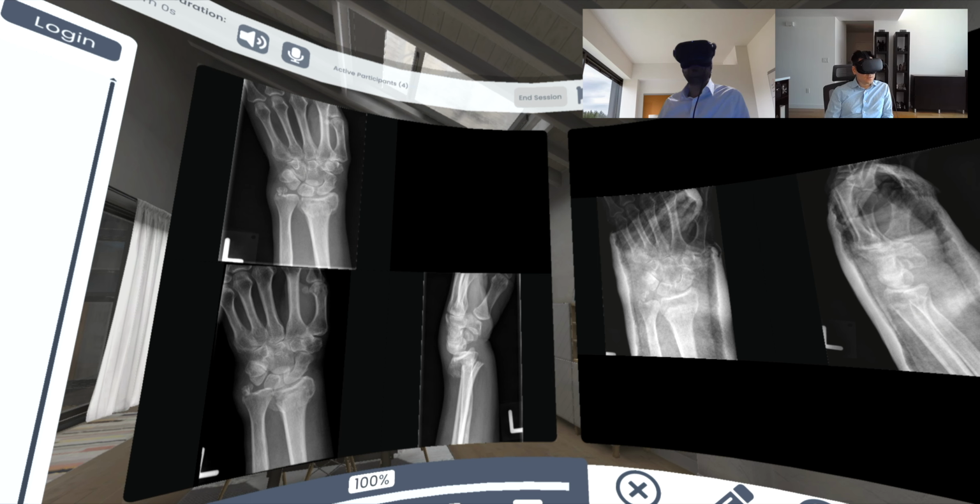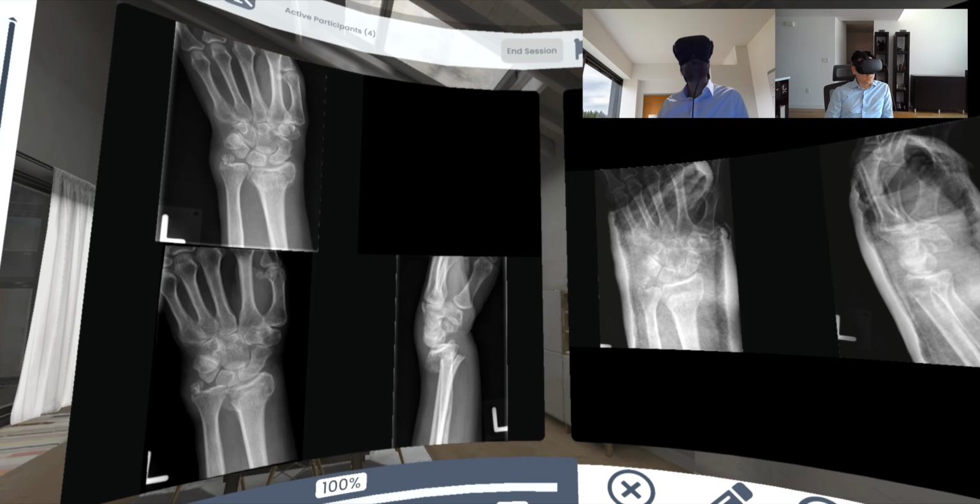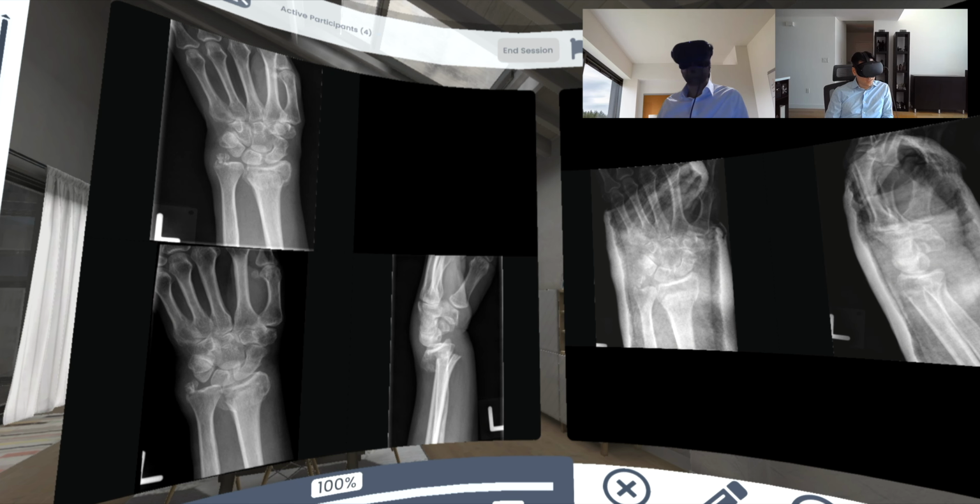Whenever you look at a fracture, the first finding will stick out for you, and you tend to focus on that fracture. But in radiology, there's this concept of satisfaction of search, SOS, which you want to avoid. So once you find an acute finding like this, you want to look for additional findings and not just be satisfied with the acute fracture.